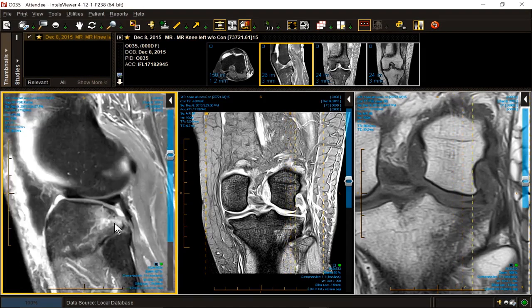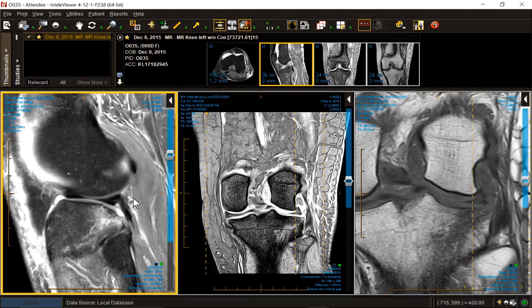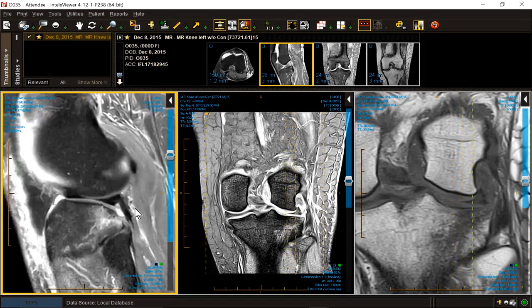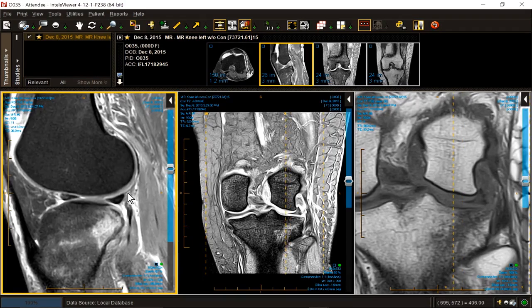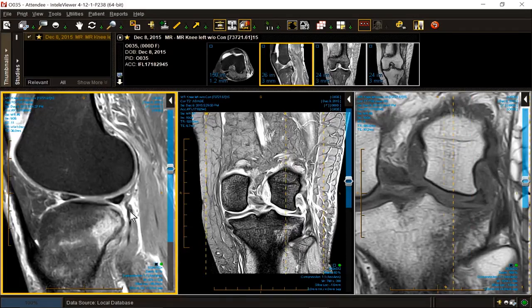So now that we know we have a fracture here, let's check out the corner. A stretched but intact popliteofibular ligament, a swollen arcuate recess, and a torn menisco-popliteal fascicle. The inferior fascicle adjacent to the fracture got pinched. There should be a fascicle here, like that one. It's missing. Well, okay, we have bigger fish to fry.